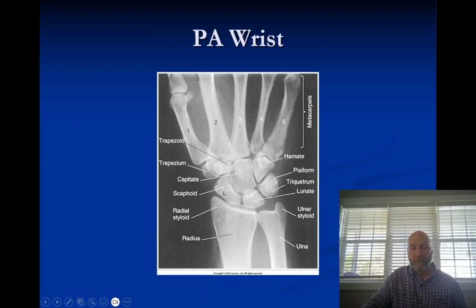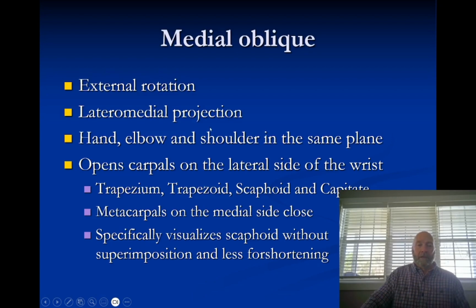So that's scaphoid. It's the lateral most bone in the proximal row of the carpal bones. So you've got all your carpal bones. You've got 4 and 4, and scaphoid is on the lateral most side over by the thumb. Most common fracture, and sometimes fractures will be on the distal end, sometimes across what we refer to as the waist, and sometimes on the proximal end.